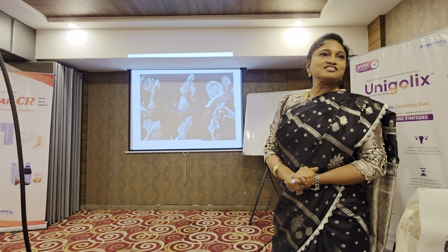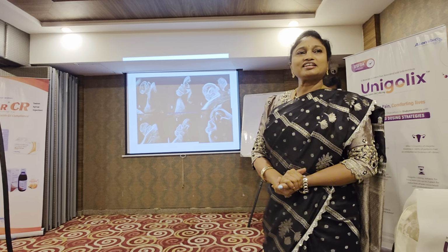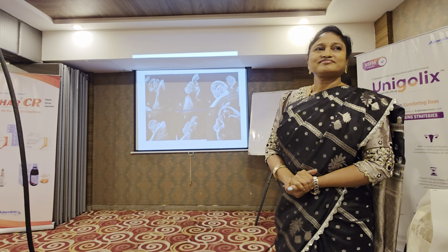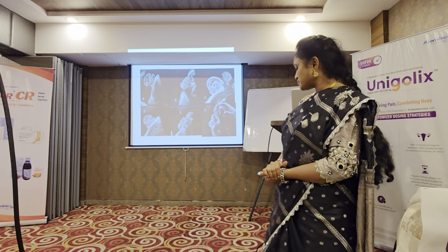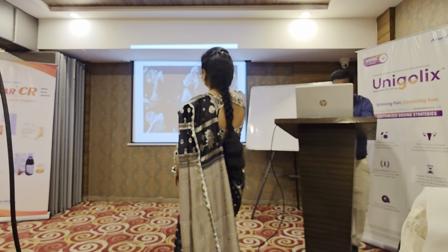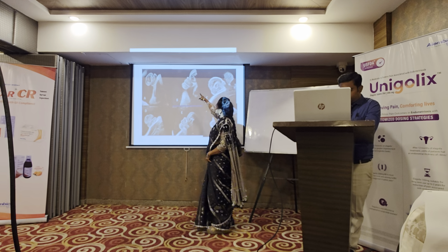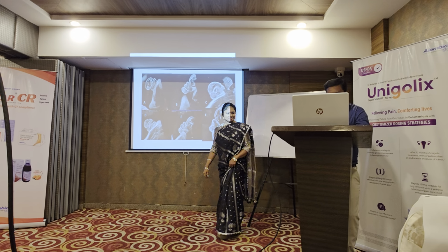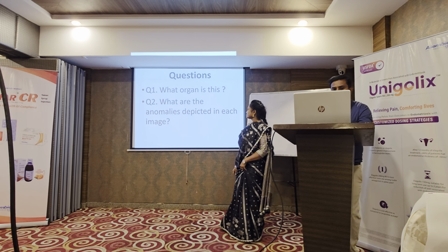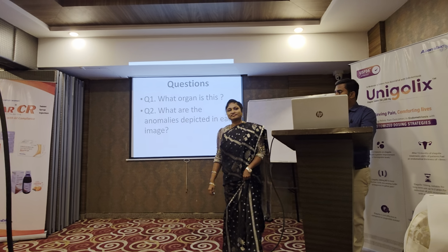So what organ is this? One clue: tulip sign. This is the tulip sign, second one. This is the tulip sign. Next slide. Congenital pyloric stenosis, either stomach or antral part.